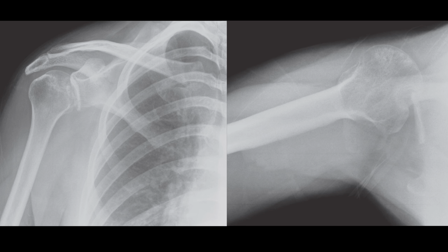of the shoulder's condition. A comprehensive checklist for shoulder radiographs should include assessing for dislocation, including the acromioclavicular joint, fractures such as Hill-Sachs, reverse Hill-Sachs, and bony Bankart defects, pathological fractures, abnormalities in the subacromial space, rotator cuff calcification, erosive lesions, soft tissue abnormalities, and lung findings that could indicate injury or pneumothorax.